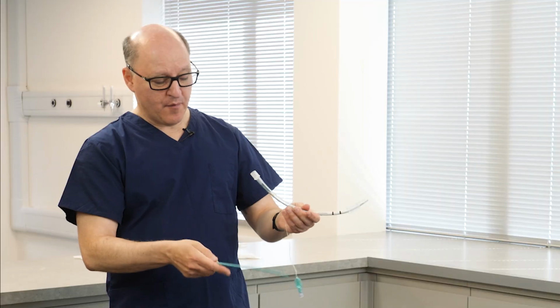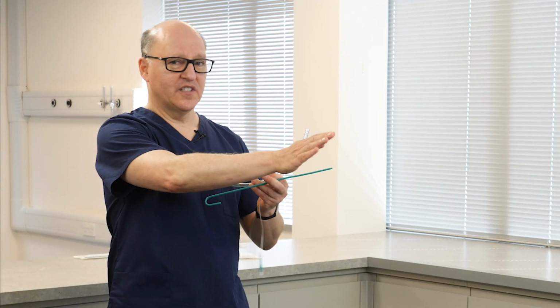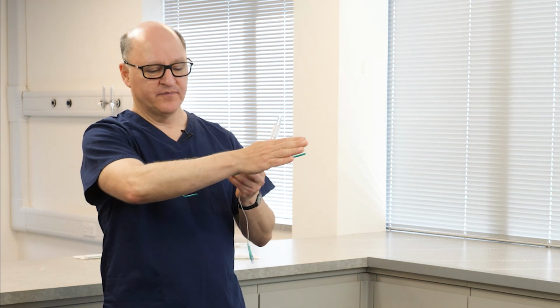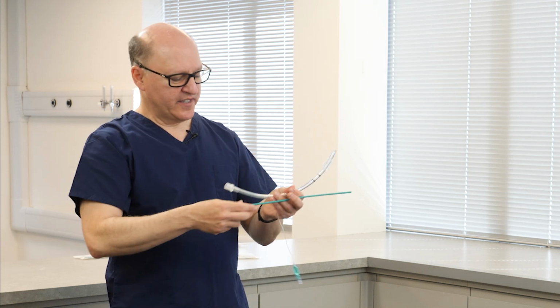And throughout medicine, there are different devices that are long and straight with distal deflections. So everything we use in narrowing body cavities have that general principle: long, narrow, with a distal deflection for visualization.